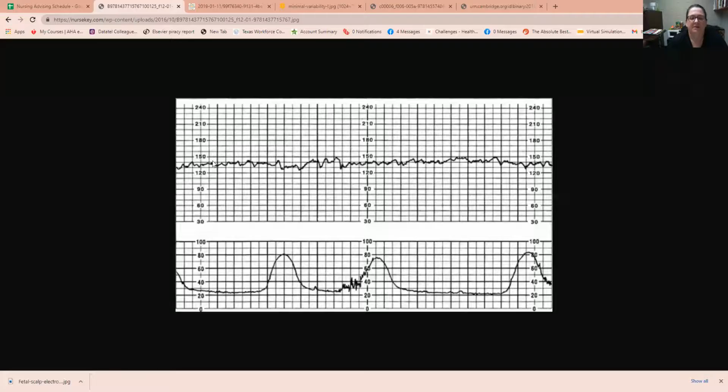All right, so we talked about fetal heart rate as if it's a constant rate. But if you notice, the line that traces the fetal heart rate was very squiggly. So let's go and look at what that looks like real quickly. See, this line is not just always the same rate, it alters. Really from beat to beat, it changes. That's what we really want to see, okay?